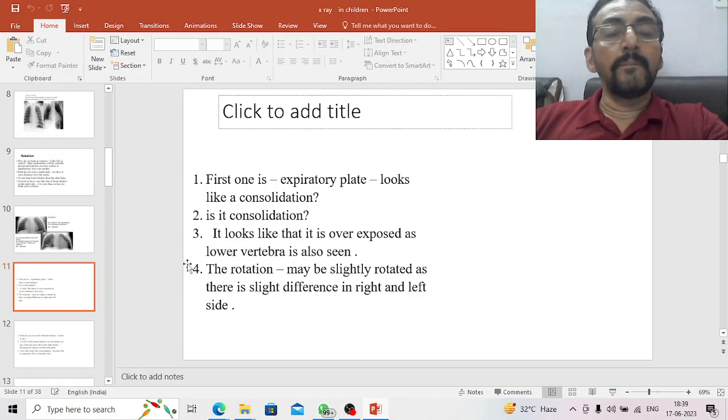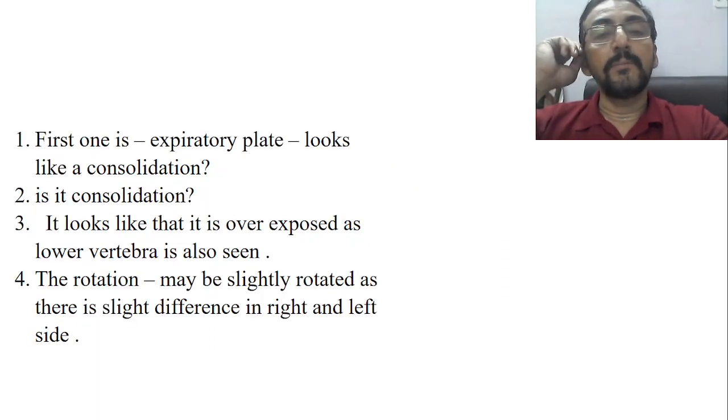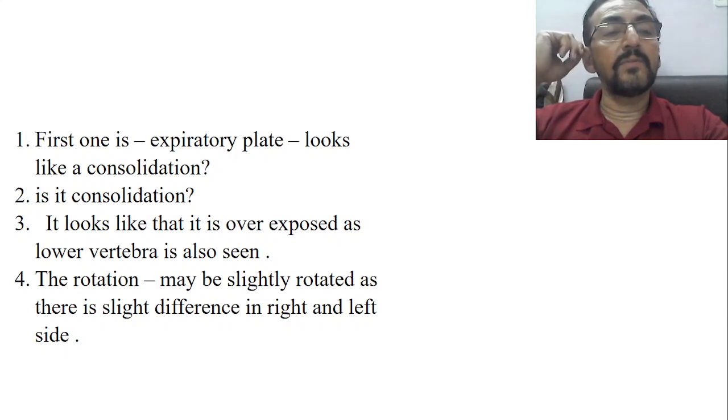Okay, now the first one is an expiratory plate, looks like a consolidation.